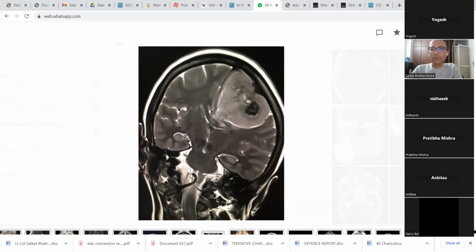Yogesh? Hemangiopericytoma. Okay, that should be a good differential diagnosis. However, we just discussed that anything peripherally located that shows some variegation of signal intensity, maybe some calcification, some bleeds, and avid enhancement.